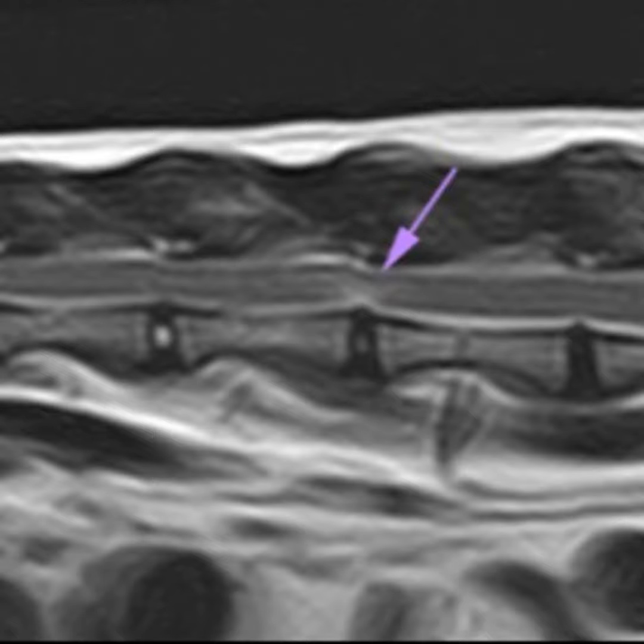Because, from what we see, it's not that common, but often we see a degenerative disc with a hyperintense lesion. And obviously, it's not a hydrated disc. I mean, all the discs are dehydrated, or a lot of them. So it's not a hydrated nucleus, but maybe it will fall into the category of traumatic disc herniation or extrusion with low volume, minimum compression.